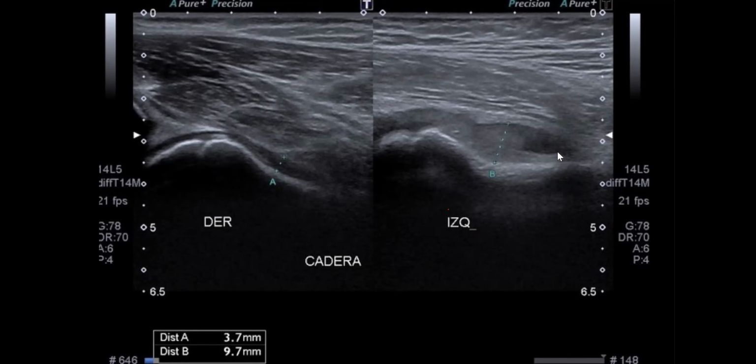Now, just a summary of the diagnosis. You diagnosed septic arthritis based on turbidity, correct? Yes. So no need to correlate with the patient history? Sir, the patient has a history of fever and pain.